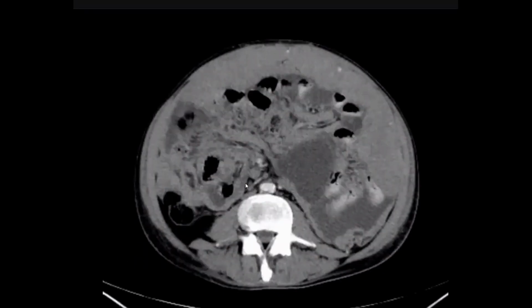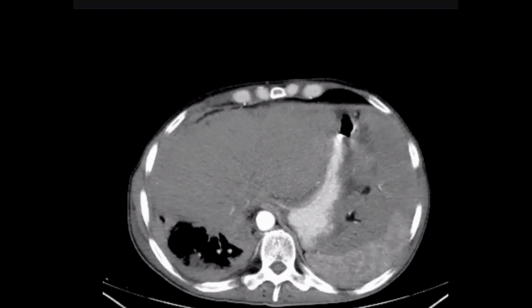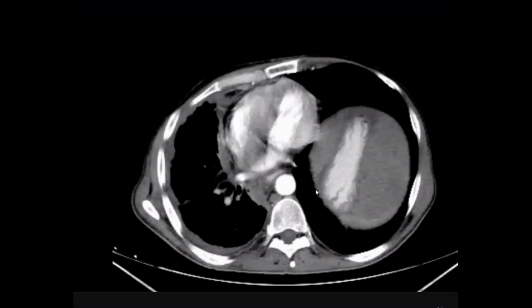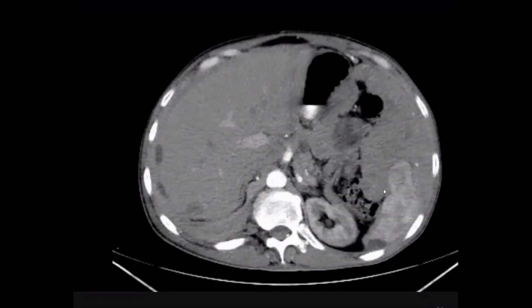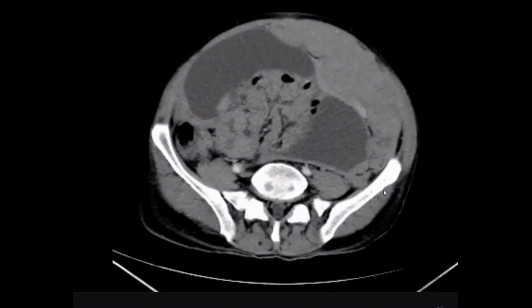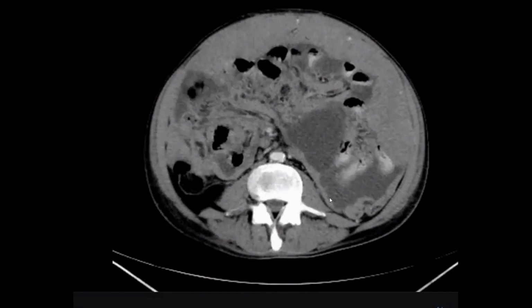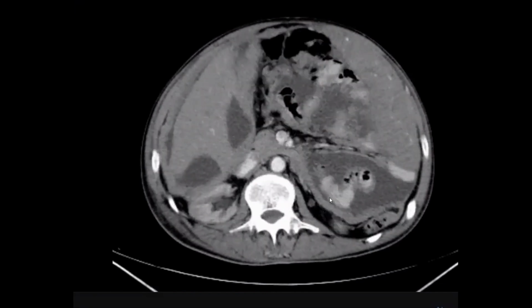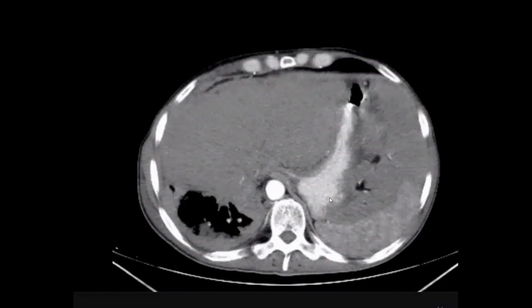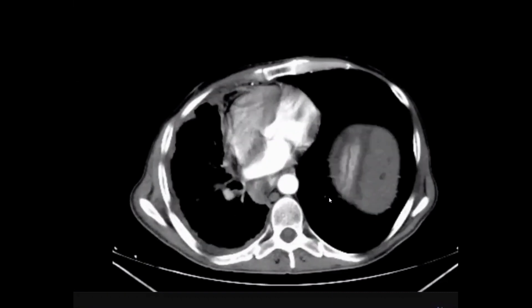I'm sorry to load on you, but okay, let's go to this. Okay, sir. Again, sir, there is diffuse peritoneal thickening, and sir, can this be primary peritoneal mesothelioma? Okay, mesothelioma. Why did you say mesothelioma? Sir, because there is marked diffuse thickening involving the pleural cavity as well.